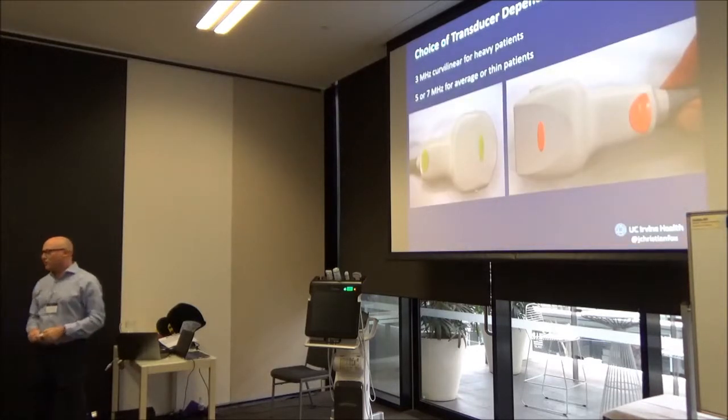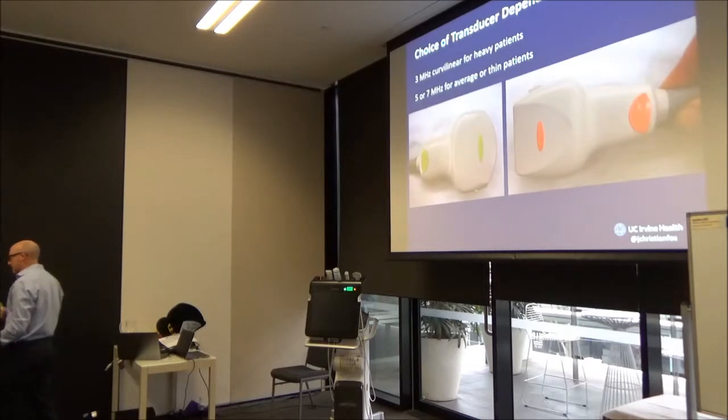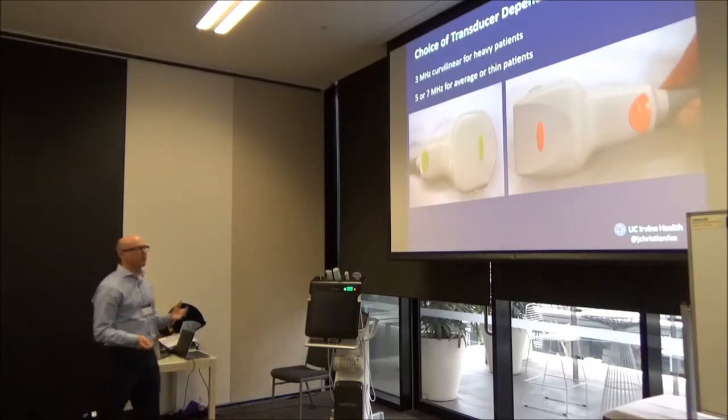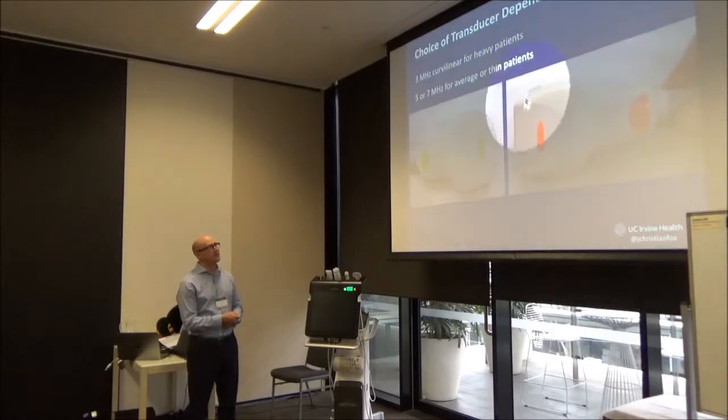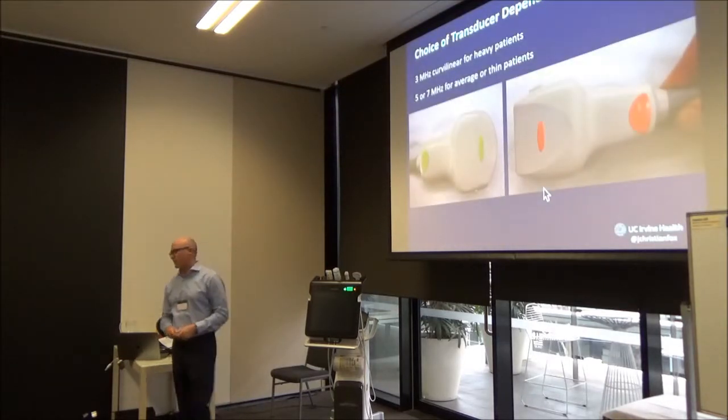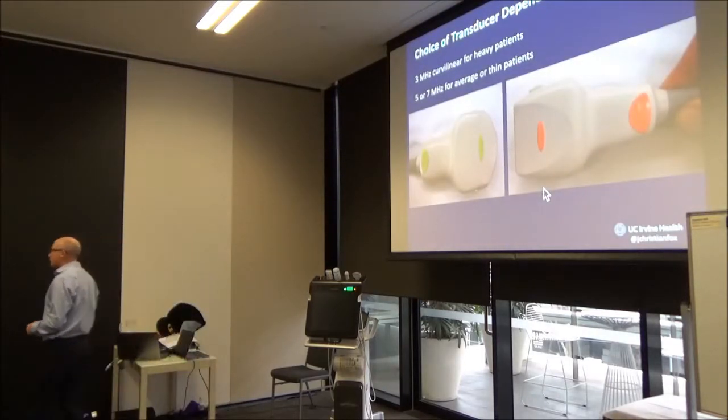Now, which transducer are you going to use when you're looking at the intestines? I like that big curvilinear probe with all of the elements in it. A little lower frequency, it's good for penetration, gets through a larger individual. But when you're working with people with a smaller body habitus, then you want to use the linear transducer, take advantage of its high frequency and its beautiful resolution.